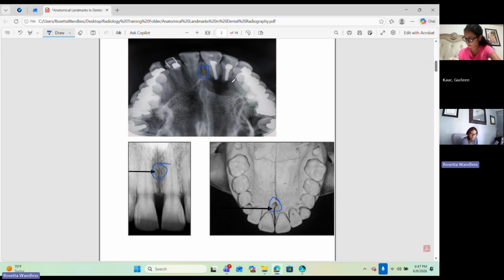Not that we're noting it here, but you see this big black area here? That's an abscess. This white part is actually a post on a root canal tooth. These are all amalgam fillings here, so these are showing radiopaque, and then you have your nice radiolucent issue.